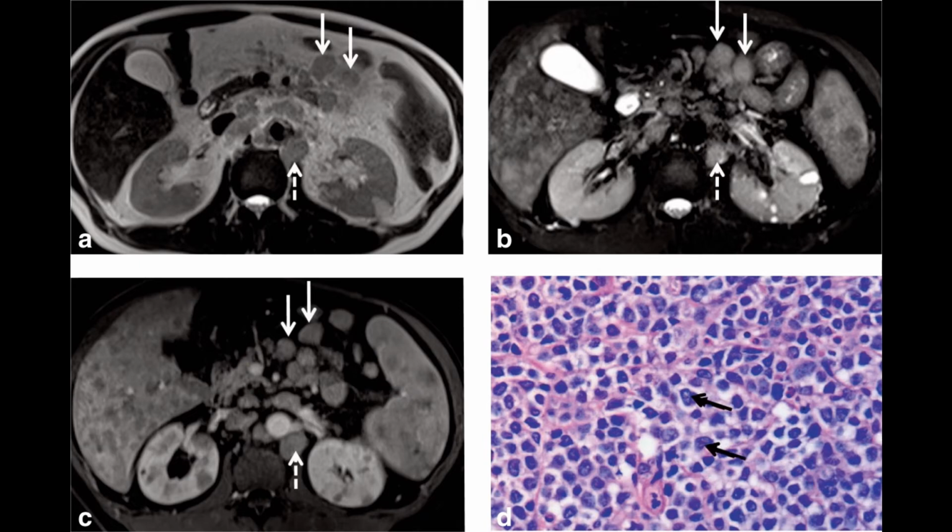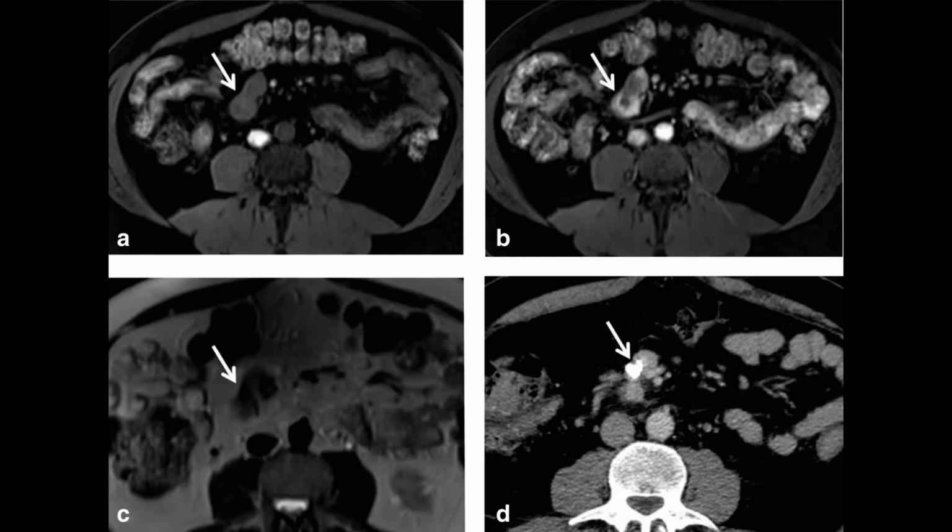This is our lymphoma present, classically what we call the sandwich sign. Now in this image, what we are seeing is a T1 weighted image, and in this T1 weighted image there is an isointense lesion. When we go to this arterial enhancement, it is showing areas of avid bright arterial enhancement.